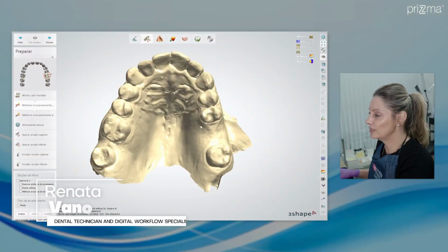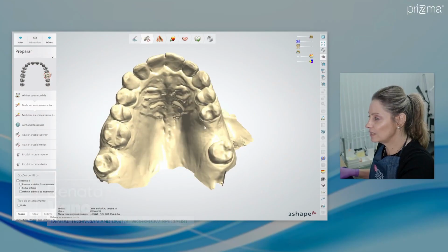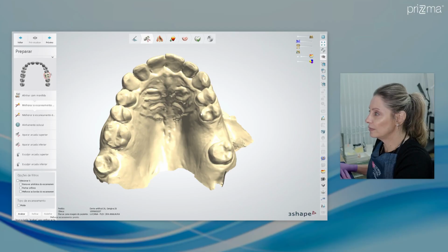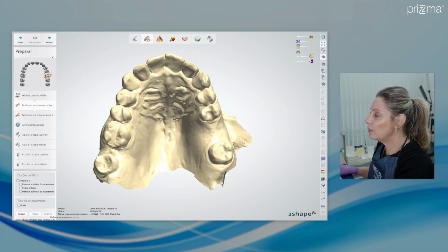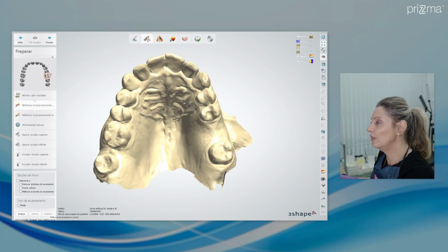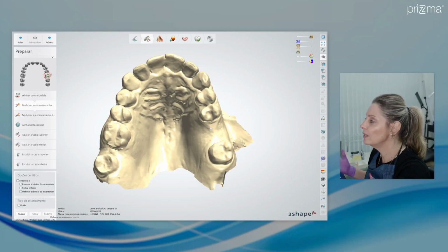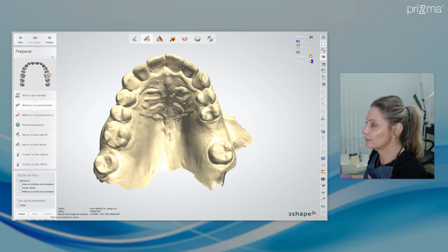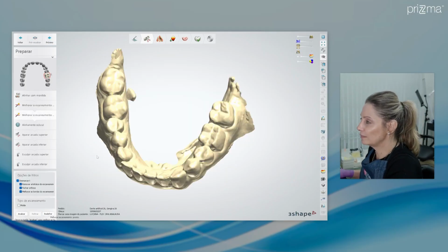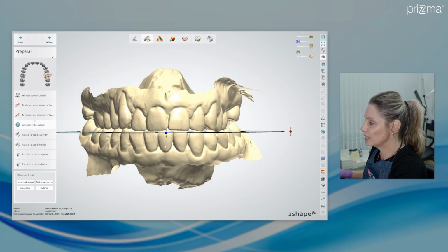Very well. So now let's design this single unit flex prosthesis. The client asked us for a unilateral prosthesis. It's temporary, remembering that it is meant to be temporary because the client is going to receive an implant. So for the patient not to be left without a tooth, whether immediate loading is possible or not, the client requests a prosthesis like this as a precaution. The first step here, the software asks us to render the meshes, then it will do the calculation.